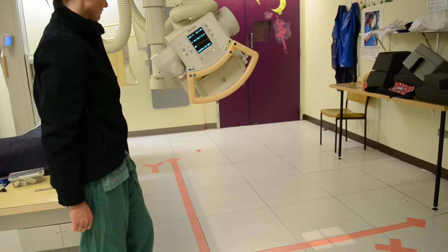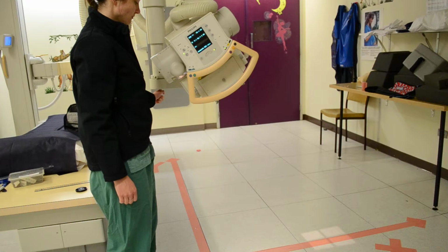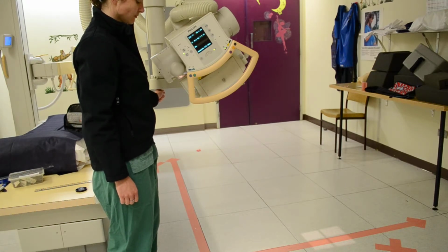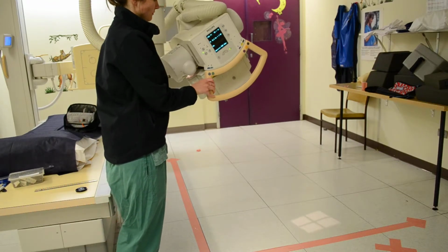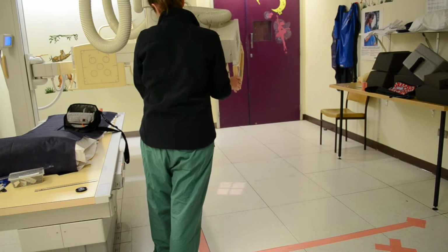Now you could imagine here there's also a Z-axis. It's basically vertical, coming out of the intersection of the X and the Y axis. And this tube will actually rotate around the Z-axis, and we'll just do that now. We're rotating the tube around the Z-axis.